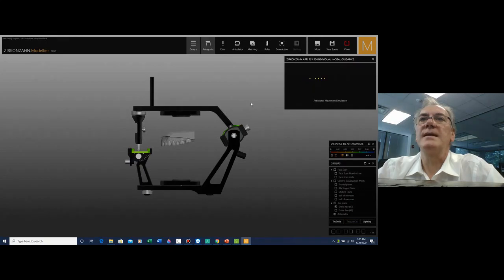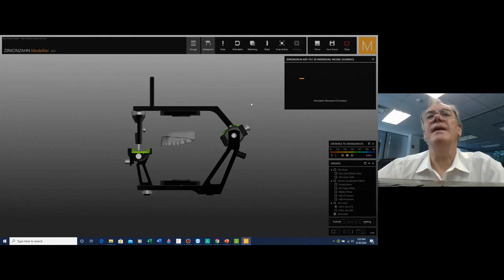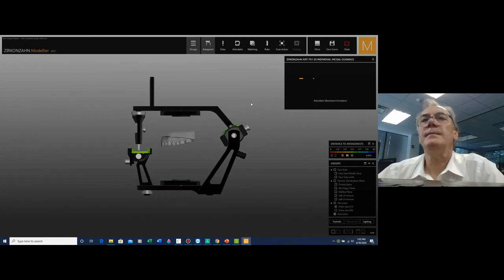Let's just see for the last time on this tooth what goes on, because I believe we have more or less the same problem on the other side. But I was curious to evaluate the other canine that has a pretty heavy abrasion. If reconstructing that abrasion, we will reacquire the actual function on the tooth.